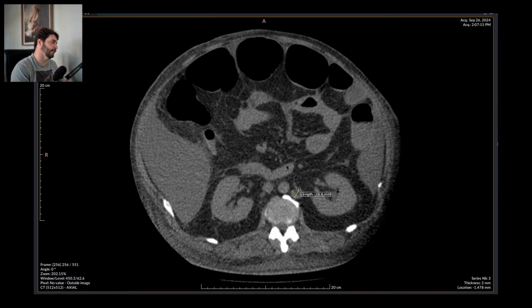It is a very profuse, very large, huge increase in intraperitoneal fluid. It is ascites, or ascites. I can't really tell how I'm supposed to pronounce that. I guess it's ascites, or I guess it's ascites. Guess.